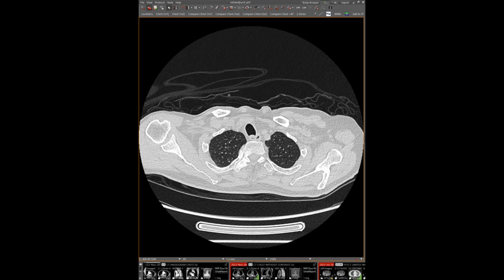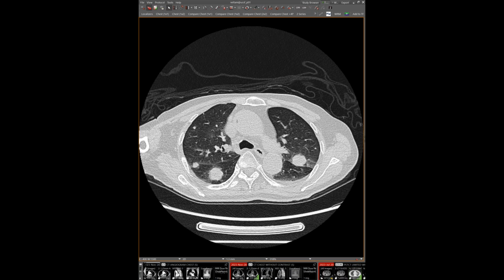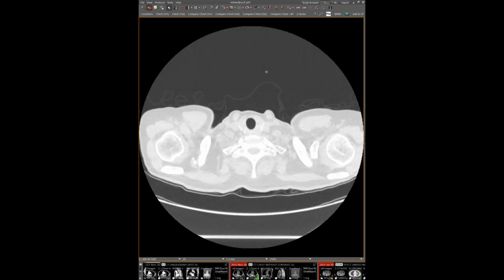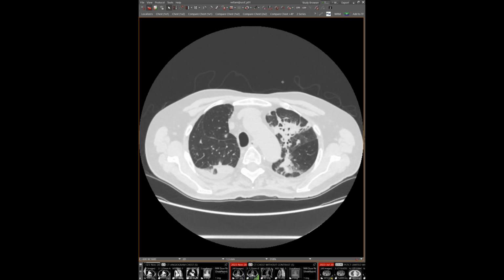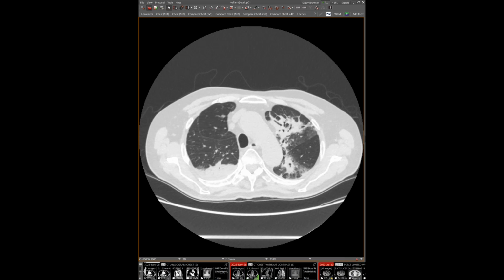for treatment of these metastases as well as metastases elsewhere in the body. And they came in a few months after this with respiratory failure and got this CT. So I think the concern was mostly for pneumonitis related to their medication, which we do see some findings that are pretty convincing of that or suspicious for that, right?